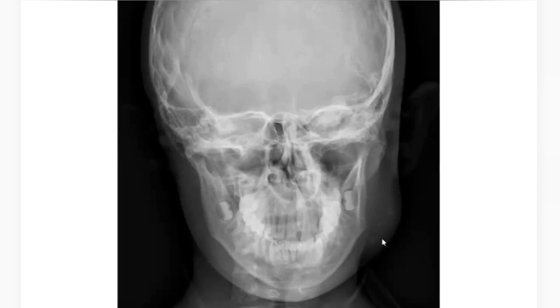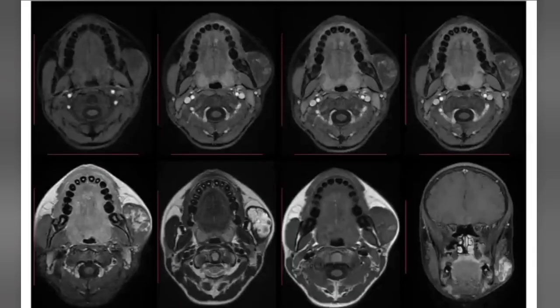A couple of things that you need to remember: lipomas usually have fat lucencies, and you must identify this when you're sitting in a cardiovascular station. You must identify if there is a swelling. Always look for phleboliths. This is really important.